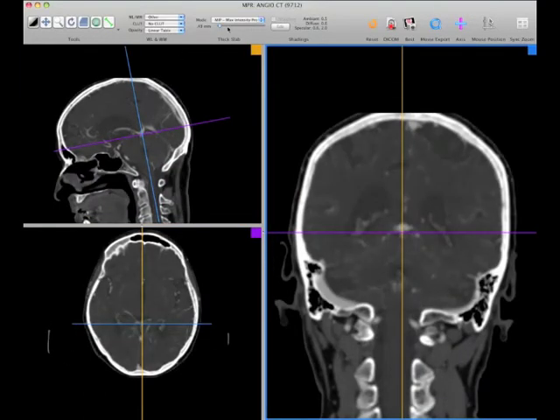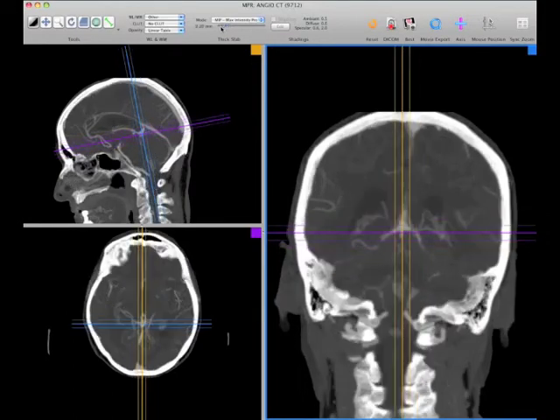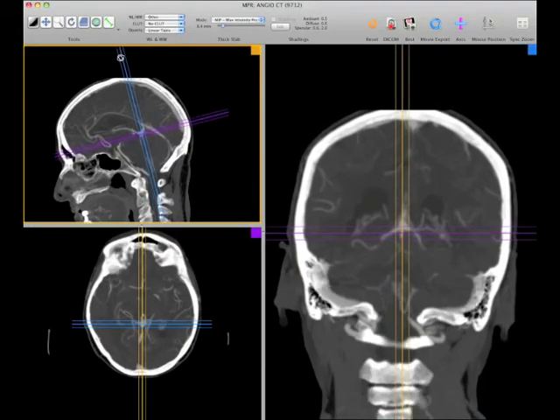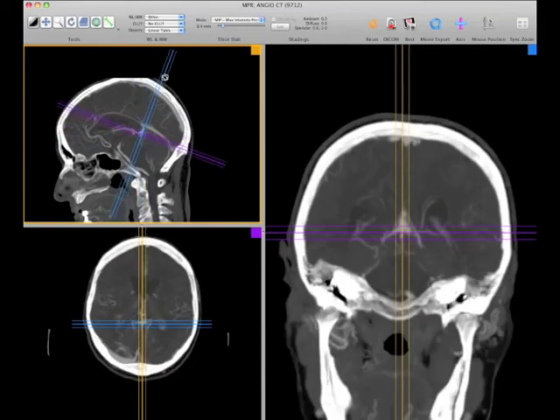And right here, we're looking straight down the vertebral canal. We can also do a maximum intensity projection here and open the number of slices. So now we're seeing what exists between this thin blue line and this thin blue line, and it's centered there. Okay. So if we make this a little bit smaller, we should be able to get just what's inside the vertebral canal. Okay, so this is something called a 3D MPR, multiplanar reconstruction, and we can tilt this to get a very unique and useful view in this orientation.